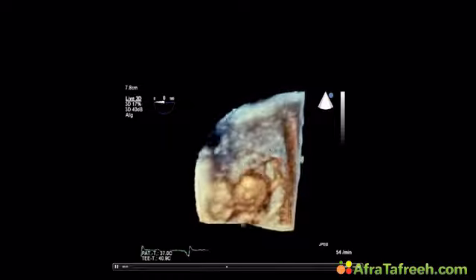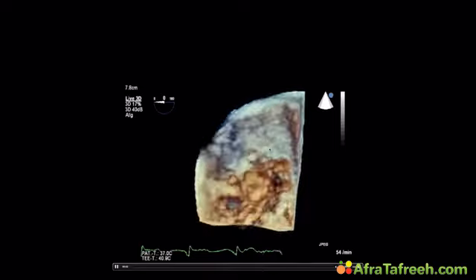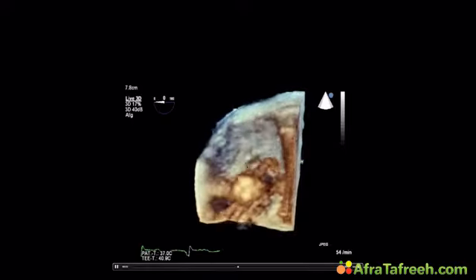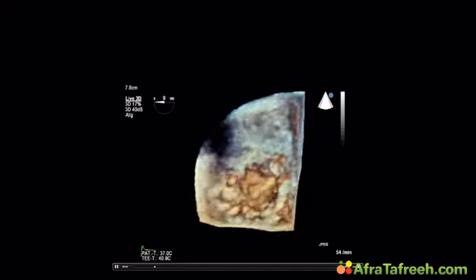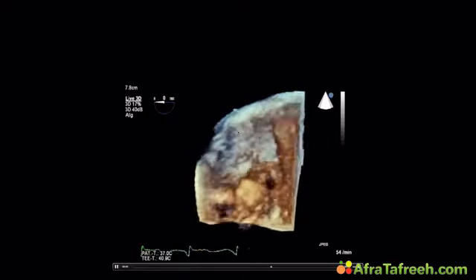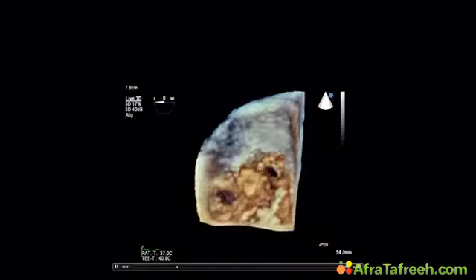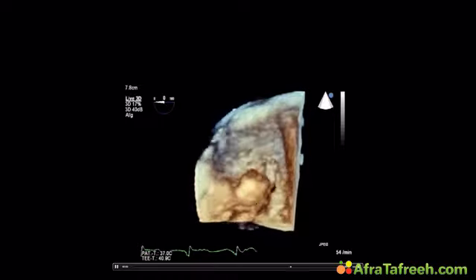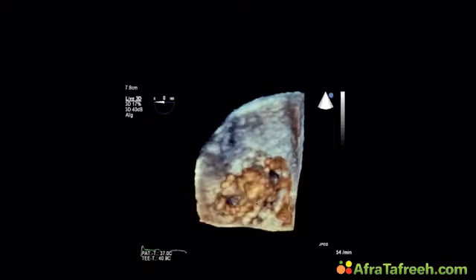And this is a patient who has had a mitral clip procedure. It's very similar to the Alfieri stitch that Philippe thought it was, and he's correct. It looks very much the same, only that with the mitral clip procedure we perform clipping of the anterior and the posterior leaflet from a transcatheter or percutaneous approach. In other words, it's a semi-invasive technique. It's a new technique that we use to treat patients with severe mitral regurgitation, where we place a clip between the anterior and the posterior leaflet to tie these two together and therefore resolve mitral regurgitation.